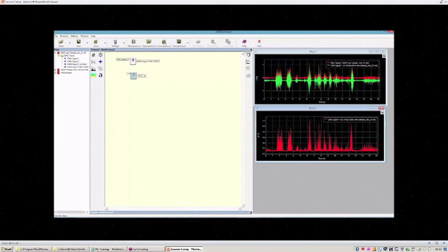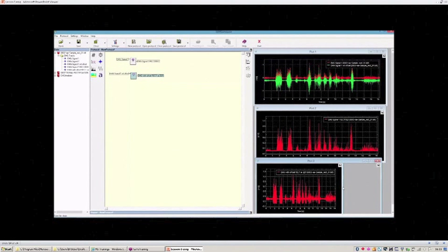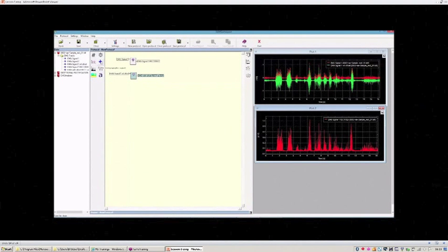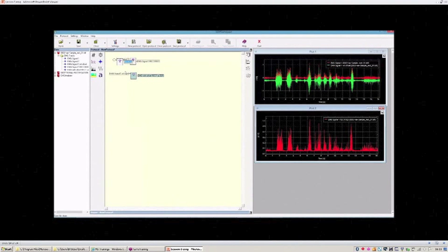If you try to rectify the signal around 0, as in the first option, now I want to show you the result. As you can see here, if you choose this option, you cannot correctly compute the rectification of the signal. So in this condition you have to choose the second option, that is to perform the rectification not around 0, but around the mean of the signal.